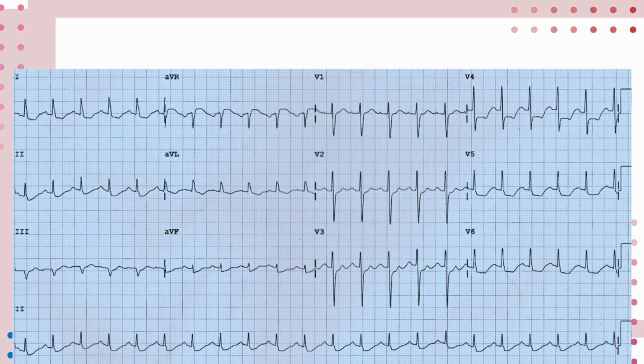Something is definitely wrong, because after seeing the peak QRS, do you see how the QRS wave dips? And you can ideally find a T wave before it turns to a P wave. I know there is something wrong, and my QT interval here is likely messed up because I'm not able to check that T wave. Now, the next thing, so I already have 2 queries. 1, there is tachycardia. 2, it's looking like my T wave is a bit inverted, right? Would you agree that it is barely visible and looking inverted?